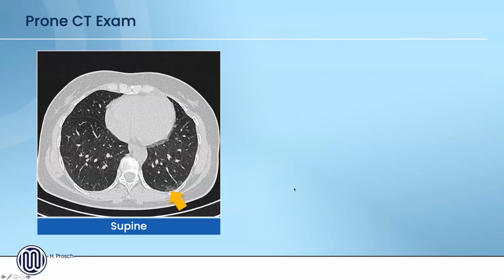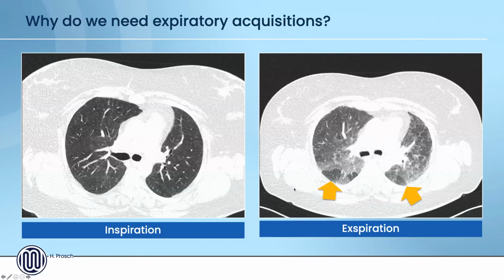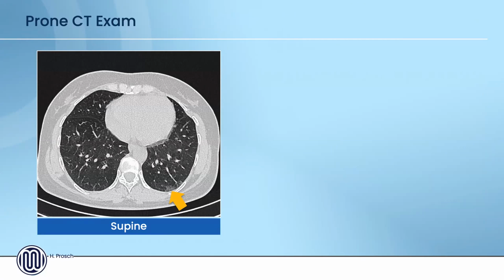And this is a patient, sorry about that, a patient with Sjogren's syndrome. What this scan tells us is that there's also an involvement of small airways, indicating that there might also be a follicular bronchiolitis involved, as this is a typical finding there. So that's why we perform this examination in all patients who are presenting with a diffuse parenchymal lung disease. And then there's another thing you should know that we are doing from time to time. We don't do this on a routine basis in our center, but some do that as well.